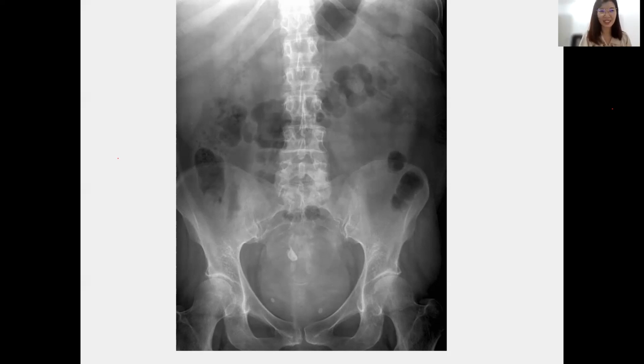What cyst? Ovarian cyst. What cyst? PCOS? No. Dermoid cyst, everyone. There's tooth-shaped calcification. Okay, it's an ovarian cyst. A twisted ovarian cyst can happen, but for this X-ray it is a dermoid cyst with tooth-shaped calcification. Why so in the middle? It can happen at the side also, but it just happens in this X-ray at the middle.